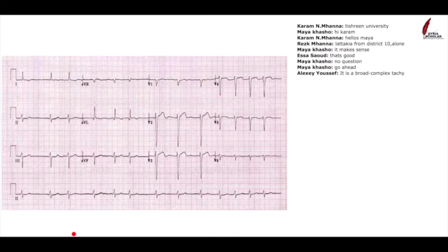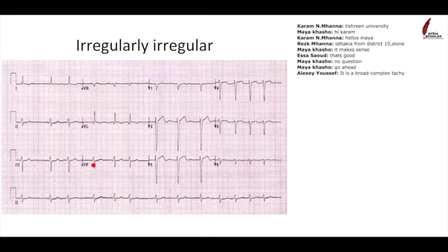What about this heart trace? Can anyone give me any ideas to what you think this might be? I'll give you a clue. So this is an irregular heart trace.